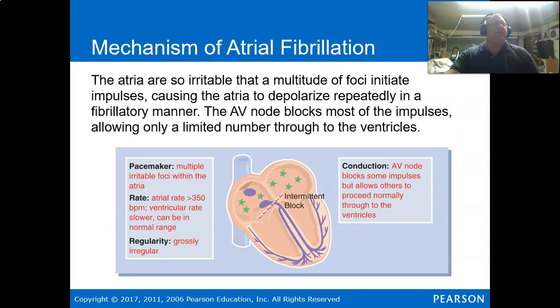Now, the other ugly atrial rhythm, the ugly stepsister here, is atrial fibrillation. Oh yeah, you're going to come to learn to hate this, especially in our area, because it seems to me that a lot of patients have this in our area. So what happens is the atria start to quiver. Okay, there are multiple foci. They just simply fibrillate.